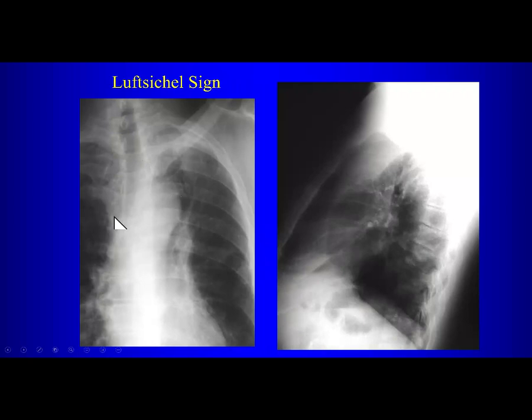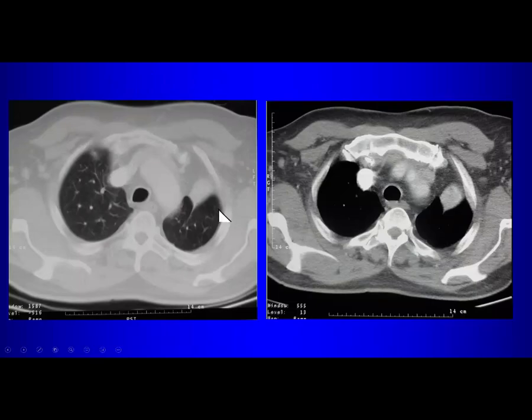Does the lateral view confirm that this patient has left upper lobe collapse? Yes. How? Bulging fissure and retrosternal opacity. Yeah, so again, we have this abnormal opacity here behind the sternum, and we have this anterior displacement of the major fissure. Okay? And so this is the collapsed left upper lobe, this stuff here. This is the compensatory hyperinflation in the superior segment of the left lower lobe. That comes up and becomes border forming with the aortic knob. And that's what gives you that area of lucency.